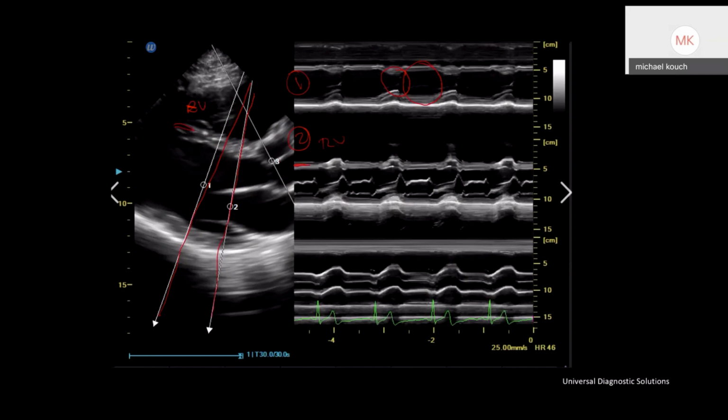Specifically looking at the mitral valve, which is this area here that I'm drawing in, when you are in diastole, the valve moves, the anterior leaflet in particular, moves upwards towards the septum, right? So we see the first part of diastole, we see our valve moving upwards here, and then as it reaches diastasis, it falls back down to normal, okay?